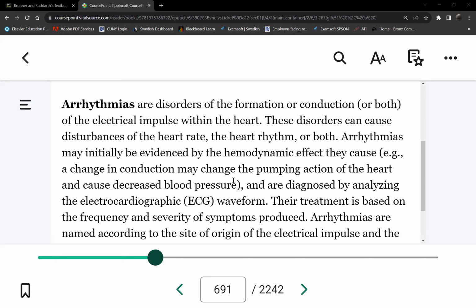So there are 5 possible questions for each of these dysrhythmias. The first question is, I'll just put a rhythm strip on the question, and simply ask, the nurse recognizes this rhythm as which of the following? That's it. What does the rhythm look like?